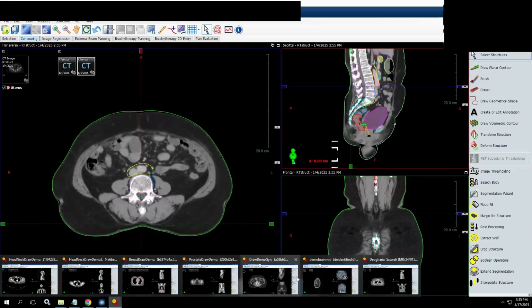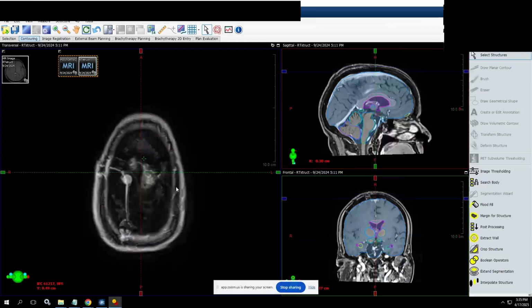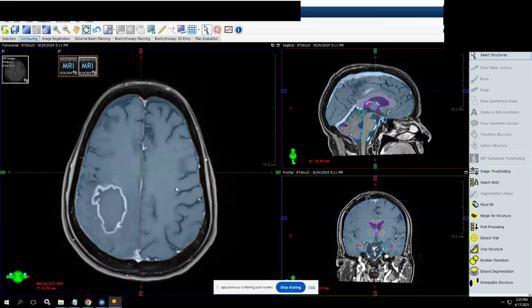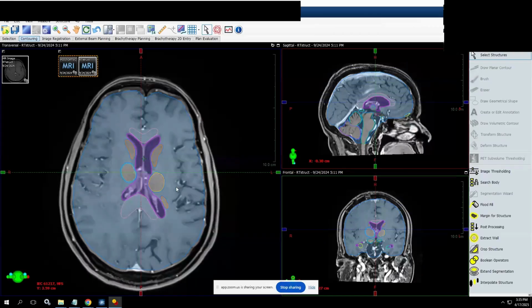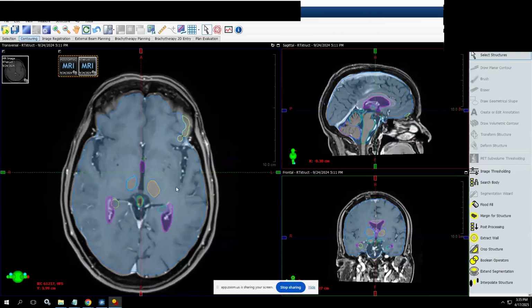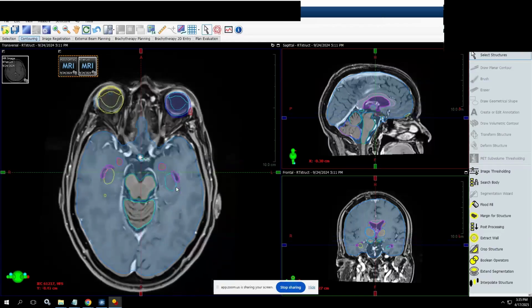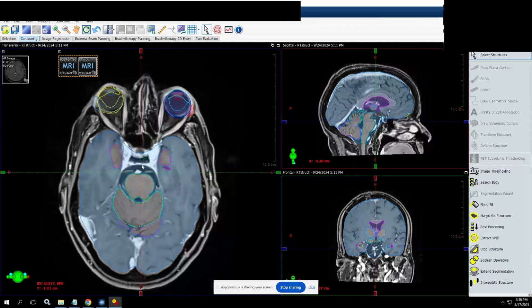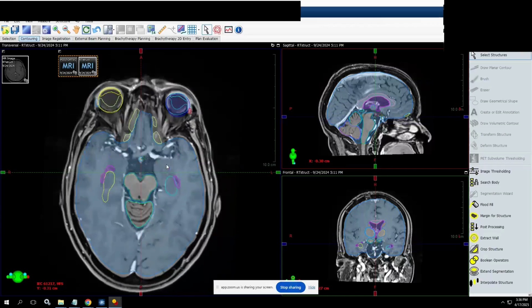The next model that we will show you is new. This is something that we have trained over the last week, and this is MRI substructure segmentation, and we demonstrate using this method that our model is capable of doing multimodality segmentation. These are substructures drawn in the brain like the orbitofrontal region, the eye, retina, cornea, the brainstem, amygdala, hippocampus, and the supratentorial brain, as well as the superior and the inferior part of the cerebellum.